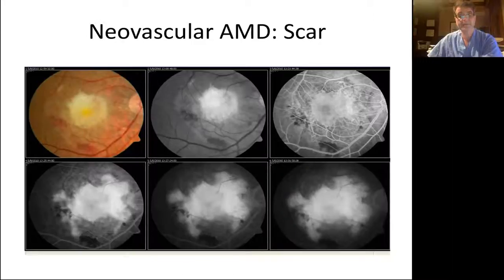So there'd be serous fluid in that cystoid cavity. Whereas a pseudocyst would involve degenerating retinal elements, and it does not convey active leakage. And that was the point behind showing outer retinal tubulation. So that's a lesion that should not be mistaken as a cystoid space requiring intravitreal anti-VEGF injection, for example. Again, thank you. Excellent questions.